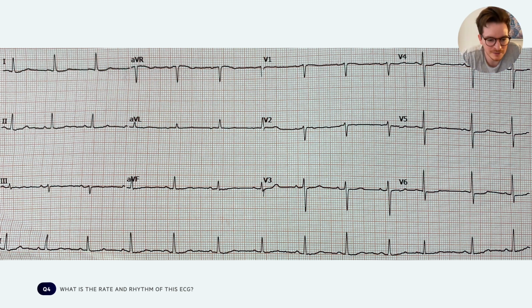So some people are saying this is normal sinus rhythm with estimates of the rate of 75 or 78. Some people are saying it's irregular. Some people are saying there are ectopics in chest leads 4, 5, 6. Yeah, I think you've flummoxed everyone, Ben.